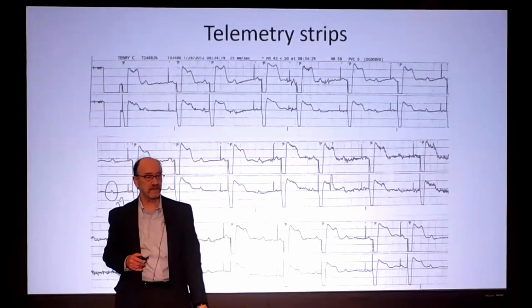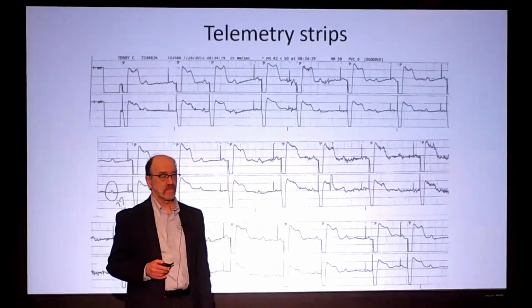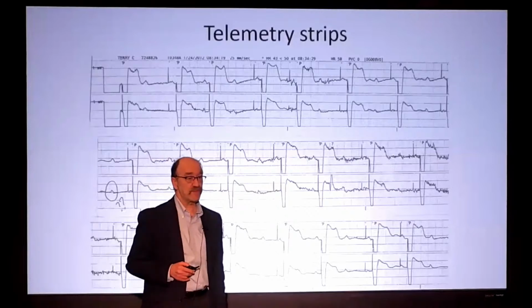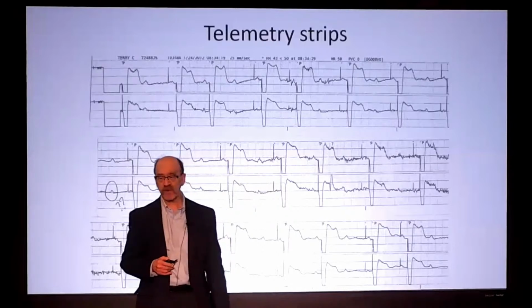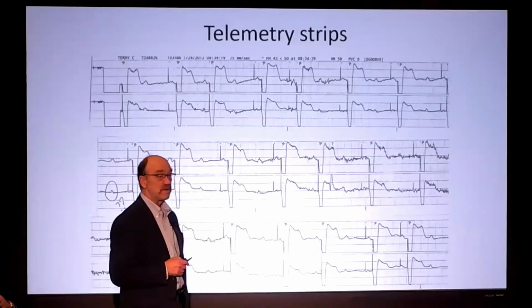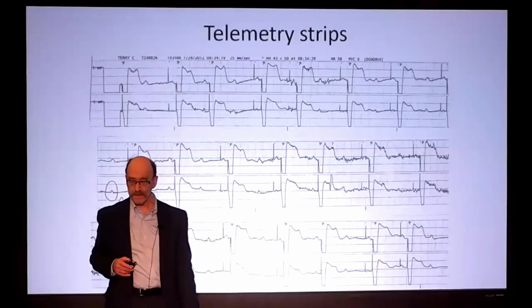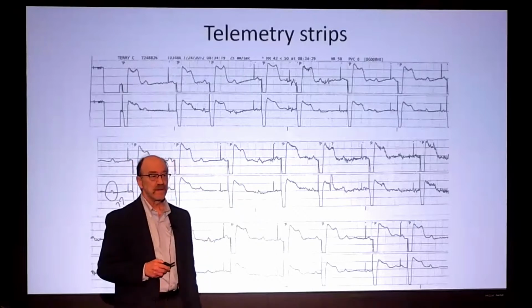So does this look right? No. Okay. First concern is undersensing for atrial capture, or for atrial sensing. So there's a problem with atrial sensing. Is it a problem with the atrial lead, or is it some sort of functional problem? How would you figure that out? You could have different amplitudes for the P waves.